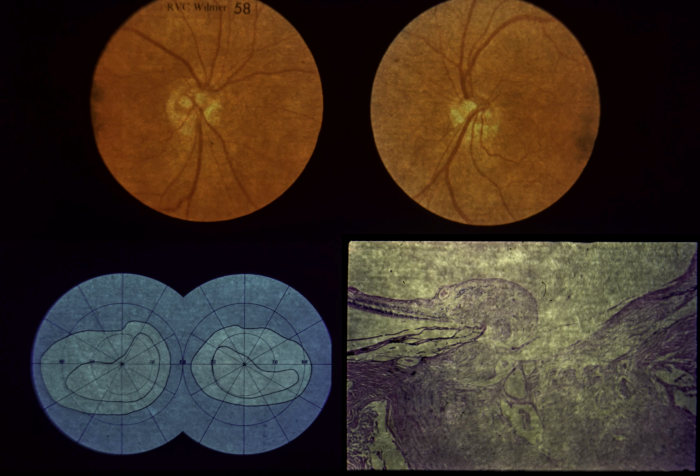hemianopic, since the smaller isopters do not obey the vertical midline. This is in marked contrast to the true bitemporal hemianopia caused by chiasmal compression. Although the visual field defects have been ascribed to the associated myopic astigmatism that is generally present in these patients, a localized hypoplasia of retina and choroid may be responsible.